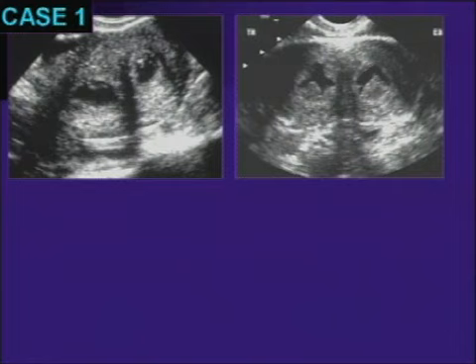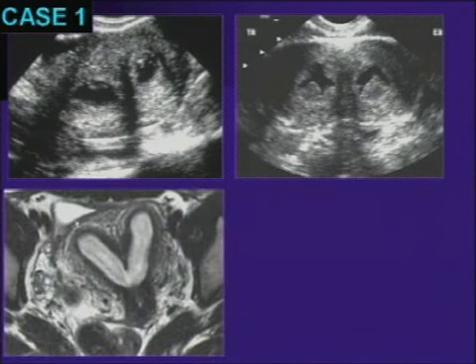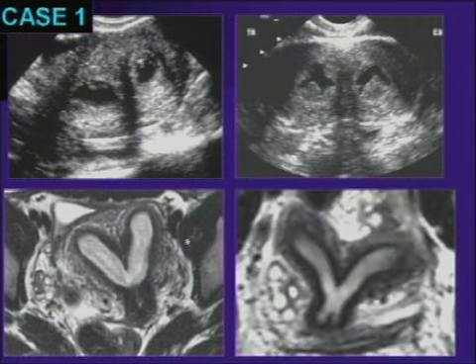And if you're not able to achieve that either with conventional ultrasound or 3D ultrasound, then MR may be helpful to you. And in this case, the most important thing to note again is that fundal contour. We can see the flat fundal contour of the septate uterus and the deep septum here versus the divergent horns here and the deep fundal cleft in the bicornuate uterus. It's also helpful to look when there's other pathology present and to look at the extent of the septum as well as the signal characteristic of the septum, whether it looks more fibrous or more muscular, which may help management decisions.